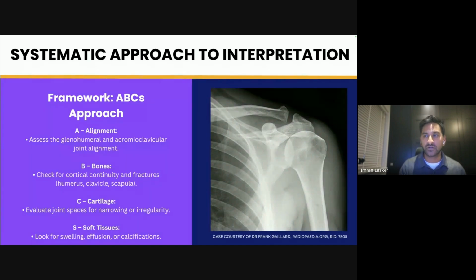Now, soft tissues are often ignored when you're looking at chest X-rays. And I think it's very, very important, because that can actually give you a clue as to what's actually happening with the underlying structures. So sometimes all you see is a whole load of soft tissue swelling. You have a closer look, and then you find the abnormalities. It's very, very important to identify soft tissues. It's all very well me saying that, look at soft tissues on the X-ray, but what does soft tissue look like on an X-ray in the first place?